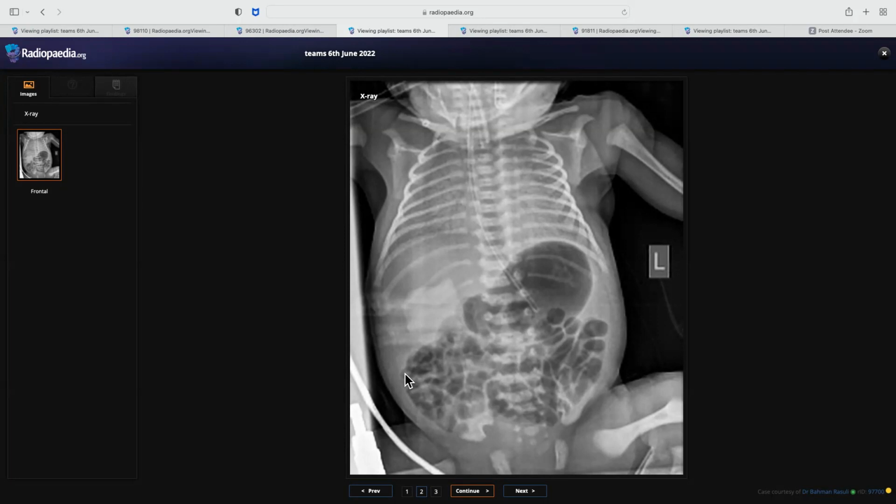Actually, I'm not making out the trachea. I think trachea is displaced towards the right. I'm not sure whether it's appropriately placed or not. It's fine. Okay, some rotation, so you do expect. Okay, fine.